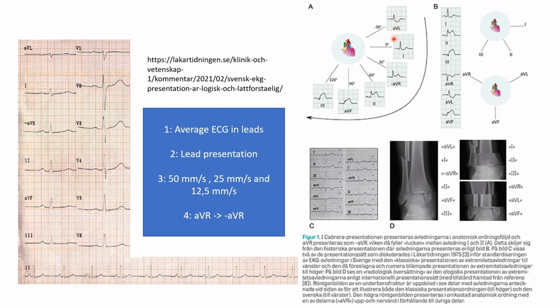So here you can kind of follow the neighboring leads. That's why they have AVL up here, and they have number 1, and then they have minus AVR, 2, AVF, and 3. So there's one more elephant in the room, and that's the AVR. In normal ECGs, AVR is way out here, the lone lead, and here they've made it minus AVR so that it's like a straight line here. They are neighbors now.